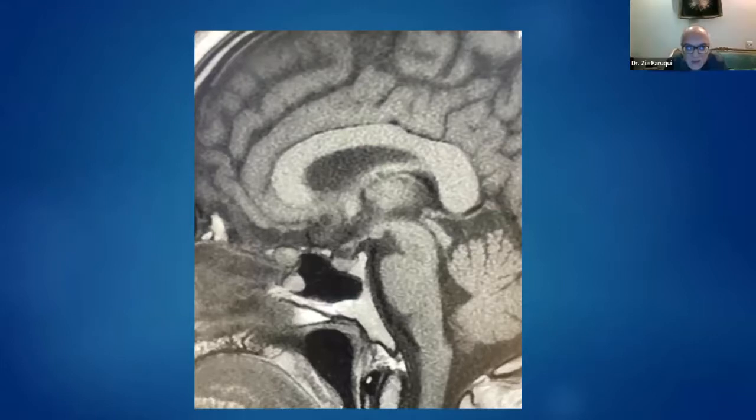हमने क्या देखा? पिट्यूटरी के क्या पार्ट्स थे जी? There was an anterior part and there was a posterior part. Posterior part में क्या होता था? Oxytocin and vasopressin. Vasopressin normal hyperintensity missing. Normal hyperintensity is missing. So there is no posterior pituitary. This patient was involved in a roadside accident. And if you look at the infundibular stalk, you can see it's not normal. It's very thin, atrophic. You can hardly see it at all.